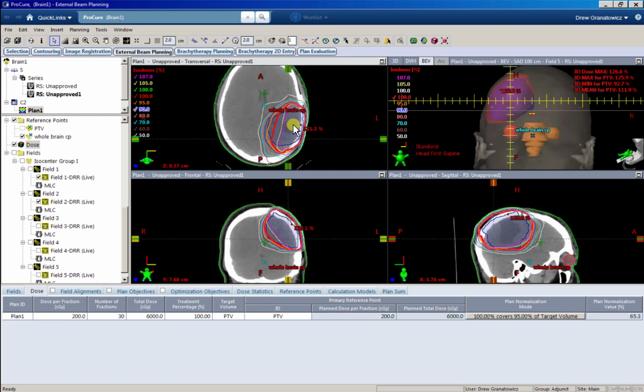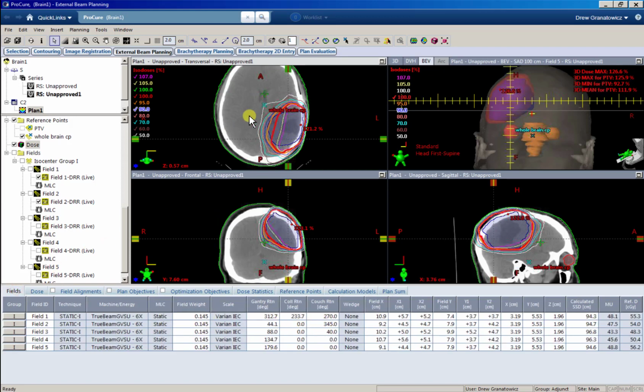And for your assignment, what we're going to do here is we're going to measure my conformity index and measure my gradient index, and your job will be to beat whatever I come up with. Okay, so for your assignment, I don't care what angles you use. I encourage you to try to find better angles than what I just found. You don't have to use the same angles as me, but you certainly can. But your job will be to beat me, which should be easy, and we'll go over that in a second.